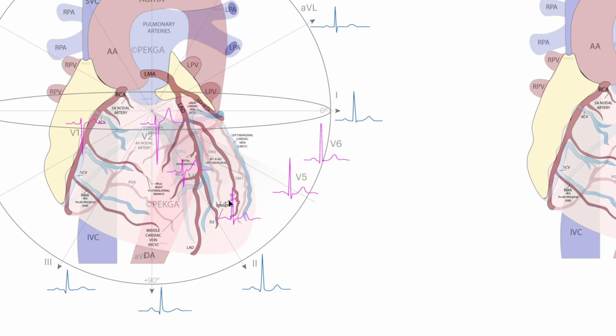But we're looking at the left side of the heart, right? Everything is inverted. Here I'm pointing to what seems to be the right side, but it's actually the person's left side. So the left lateral side seems to be diminished in oxygen, and that can sometimes happen during even sinus tachycardia.